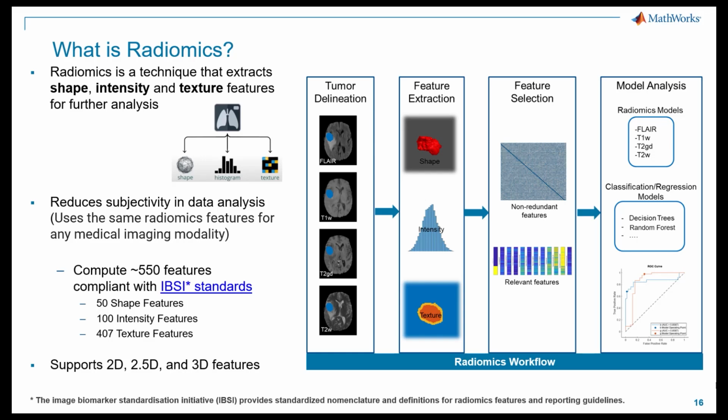Any features that are internally similar, we can discard. We can also find which information maps well and is predictive of the decisions we want to make. So we can pare our data very efficiently. And once we have these data paired, we can then build some kind of predictive machine learning model with which we can infer and make our characterizations of our data.